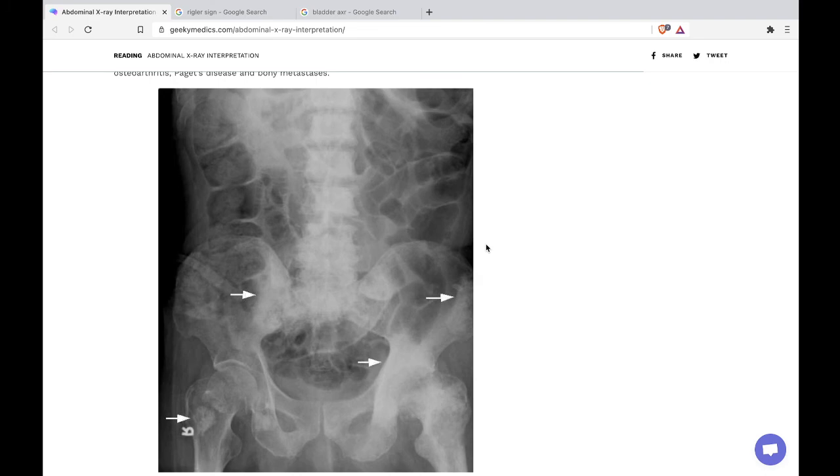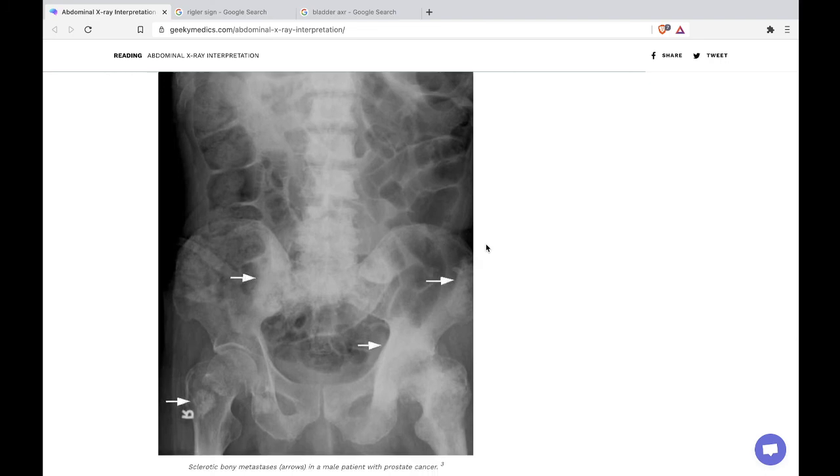Then you want to look for BBC. B stands for bowels and other organs. So you look at the small intestines. Small intestines doesn't look dilated, it looks normal. Large bowel doesn't look too dilated. You can measure if it's more than 6 cm, or more than 9 cm in the case of the cecum. It doesn't look like the large bowels are dilated.